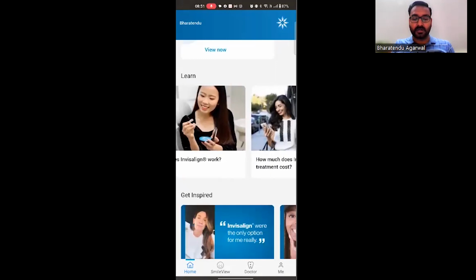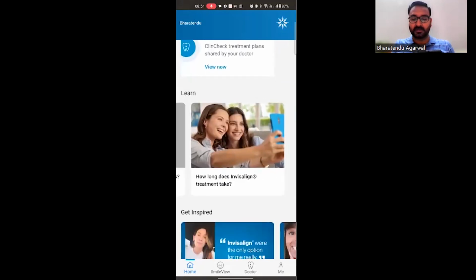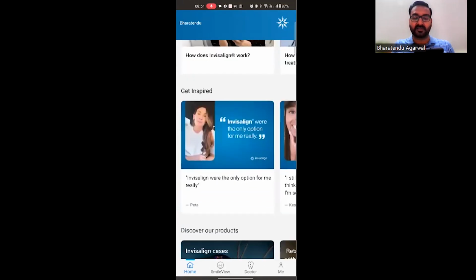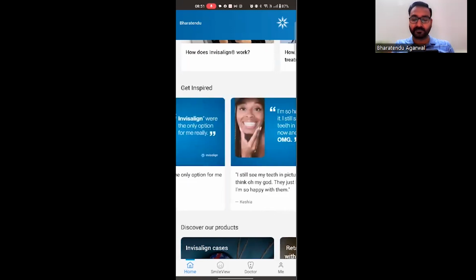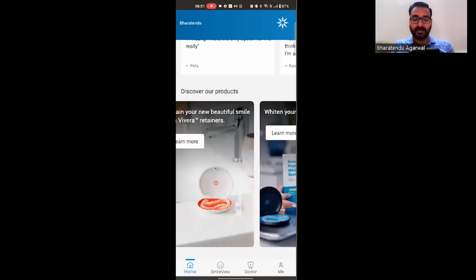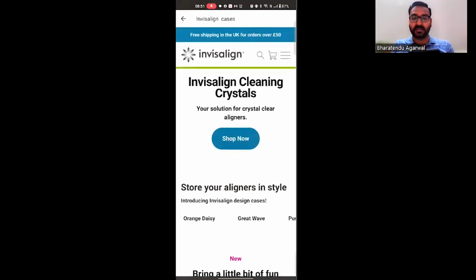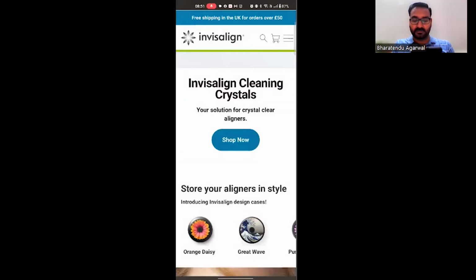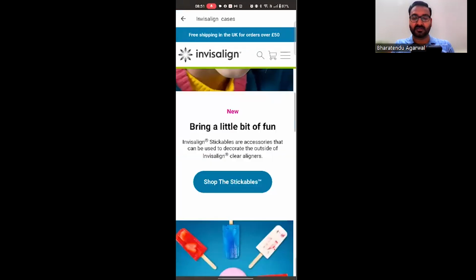So it has some data as to how Invisalign works, what is the treatment cost, how Invisalign is different, and a bunch of other things. Basically, this is all counseling material and advertising marketing material, as you would understand, to try and get to know Invisalign better. I think these are some blogs by happy customers. And yeah, you can access the Invisalign shop directly from your app where they have certain tools and accessories. I will be addressing the tools and accessories sections later separately.